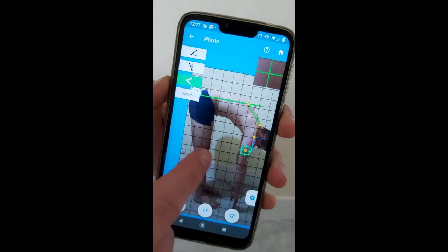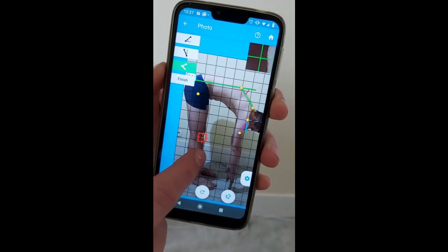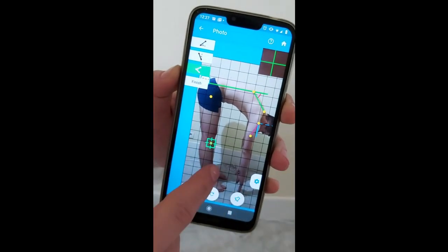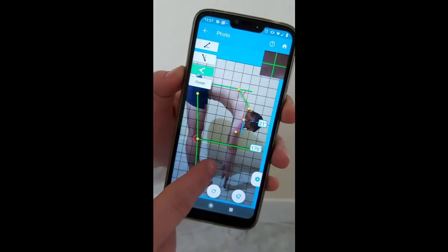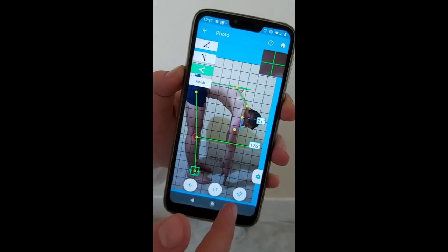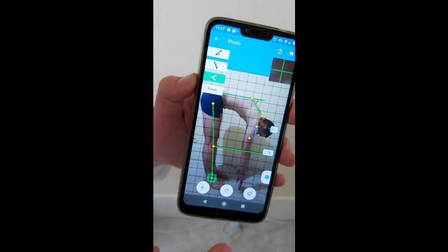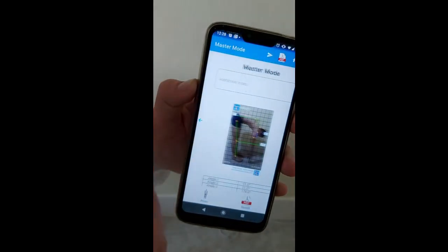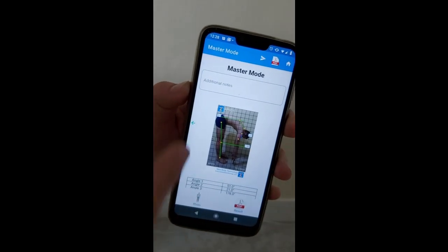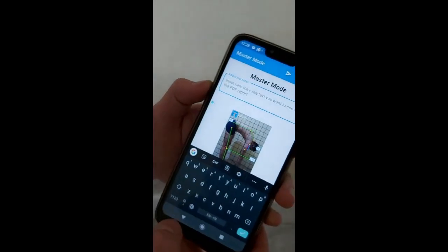Now we will measure an angle between 3 points that are represented by the markers that I'm inputting now. And here we see 176 degrees. Once you are done, you click the Finish button and you will find the image you've just generated and your report. You can also add your additional commentary like so.